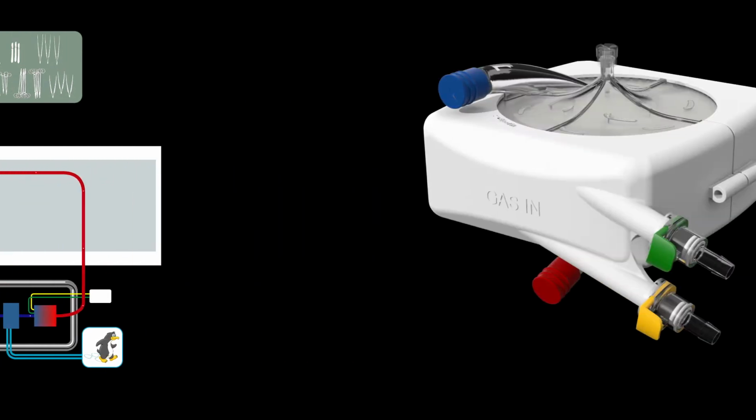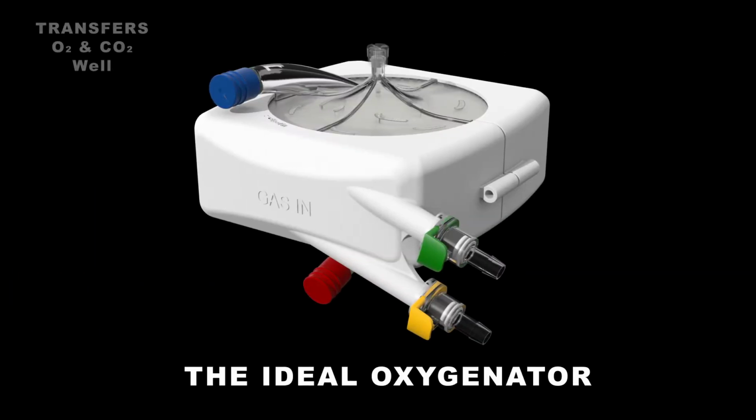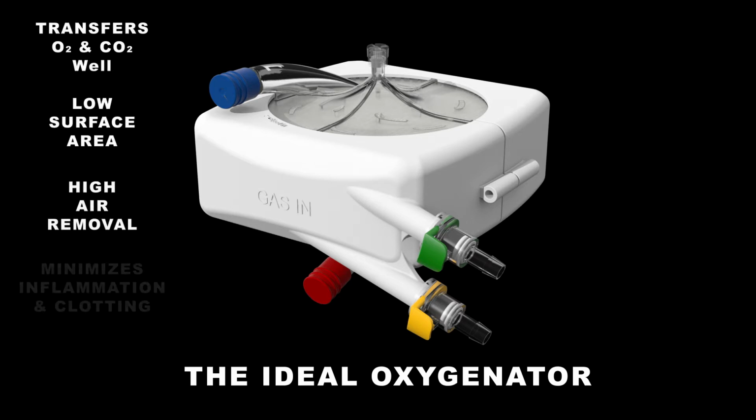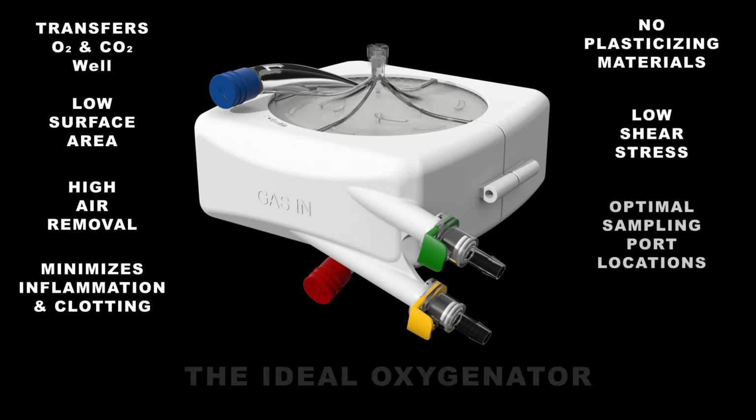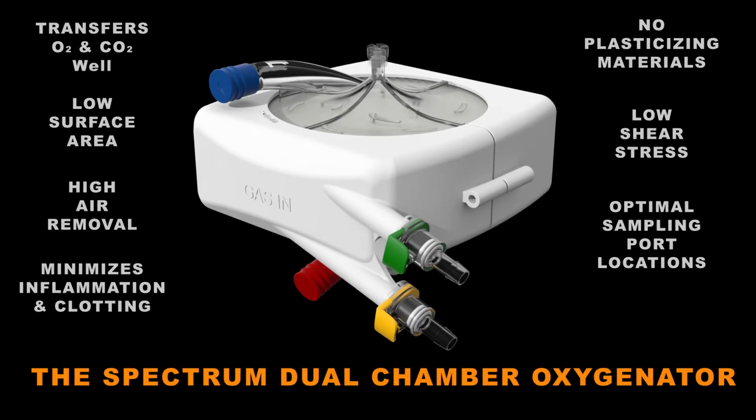The ideal oxygenator transfers oxygen and carbon dioxide well, has low surface area, high air removal capability, minimizes inflammation and clotting, uses no plasticizing materials, has low shear stress, and offers optimal sampling port locations.